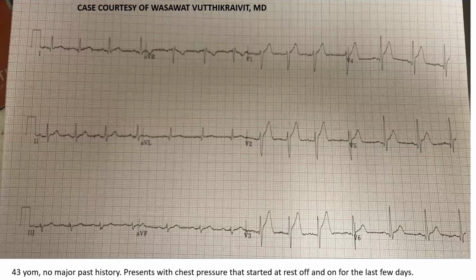I want to show another case. This case was shared by my prior great fellow, Wasawat. So this is a 43-year-old man with no past medical history. He presents with chest pressure that has been going on at rest off and on for the last few days. This is his EKG.